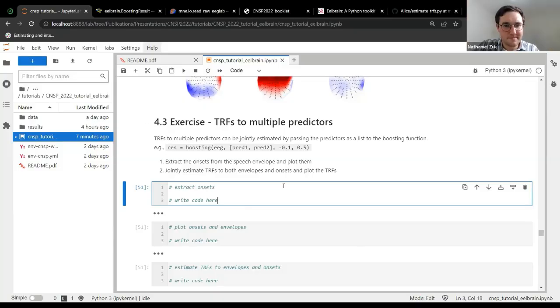Gotcha. So it shouldn't be impulses, but if you use that function, you have to give it time points and values at each time point, and it will give you an NDVar with impulses at those. So that's not what you want here. I see. So when you're looking for the onsets, you're looking for the first derivative of the change. Yes. Maybe that wasn't too clear. Sorry about that. I can maybe show you for the sake of time.